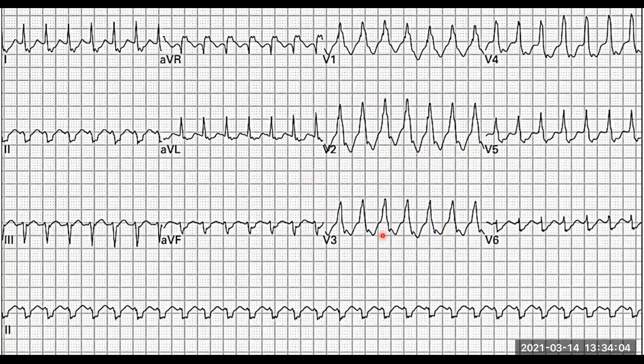So if we were having a wide ventricular complex, it would imply that it's a... I know I can't hear you, but I'm just pausing so that you can work it out in your own mind. A wide QRS complex with a tachycardia, in other words, a tachycardia of ventricular origin, would be a ventricular tachycardia. So that's what we are seeing over here.